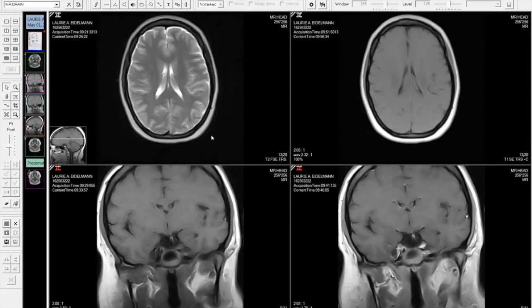We've done hanging protocol series so that, for example, mammograms, MRs that may have 15 or 16 image series, I can display a group of them, then I can choose to display the next group, and then the next group, and I have these individual hanging protocols, all of which I can build a set from.